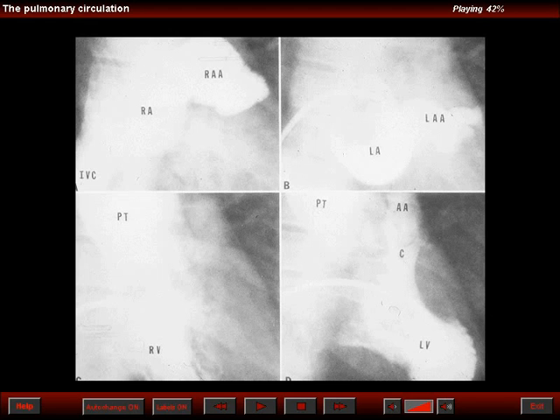We note in the top images the left-sided position of the right auricular appendage, RAA, and note also the position of the left auricular appendage, which projects below the right. So this is to show that occasionally in corrected transposition, a bulge may be seen along the left heart border that is superimposed or below the bulge produced by the abnormally located ascending aorta.